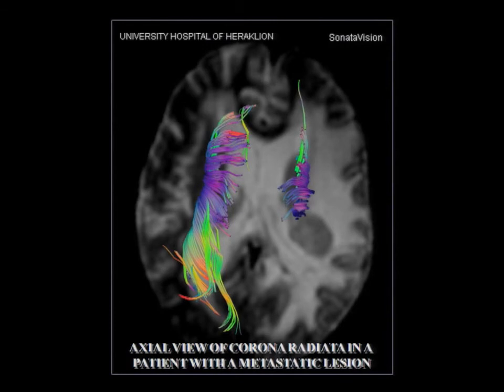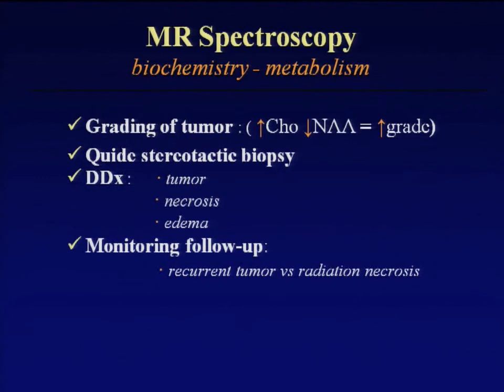But of course, it's very useful for a neurosurgeon to have functional MRI on one hand, and on the other hand to have fiber tractography and the tumor. It's very useful. Then spectroscopy, giving information about the biochemistry, the composition of the tumor. We all know the increase of choline, giving information about the turnover, the proliferation, the destruction of neurons, decrease of NAA, and differentiate tumor necrosis and edema and monitor follow-up.